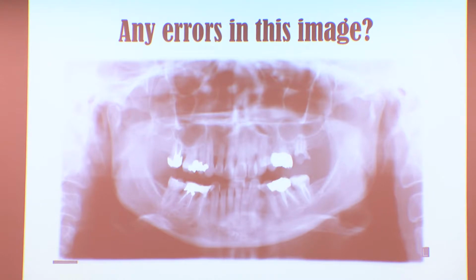This one looks really bad. Patient was too close. Chin position looks okay, maybe just a little bit tipped down. And then again, you can see the hyoid here overlapping the mandible.